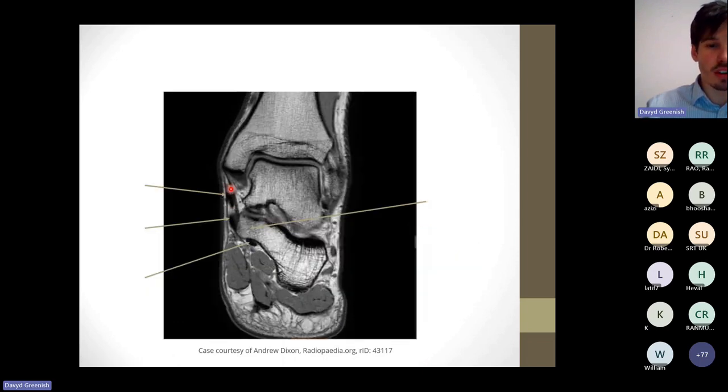And how about this? I just wanted to show you that you could look at the medial aspect. There's a couple of things that show this is medial. I've got one arrow to a bone here. Does anyone know what specifically this is pointing to? There's a bit of bone. You might see it more classically on your X-ray, so it's a slightly odd thing to see. Yeah, spot on. Sustentaculum tali, the medial aspect of the calcaneus, and then we've got three tendons here.